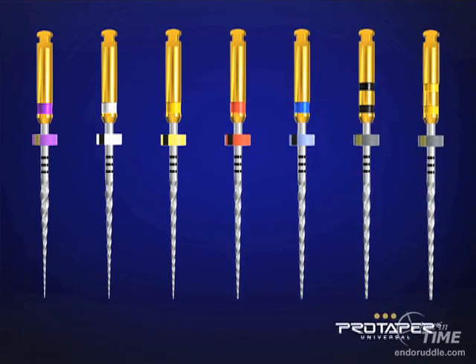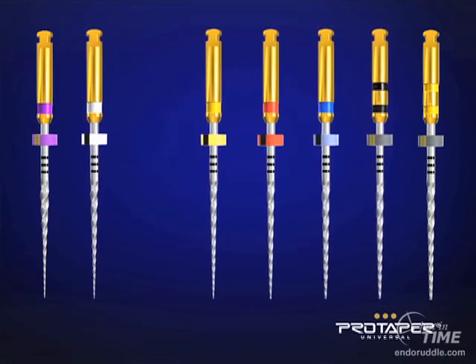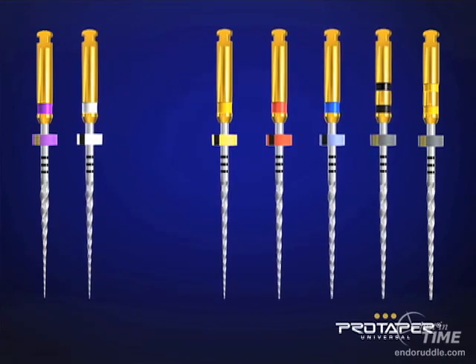we have a number of instruments that can help impart the shape. We basically can divide the family of instruments into shapers and finishers. Classically, you'll hear most people discuss the purple and white as being the ProTaper shapers, and then yellow, red, blue, double black, and double yellow banded handles are our finishers.